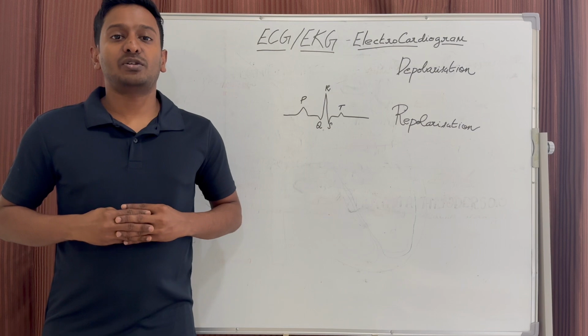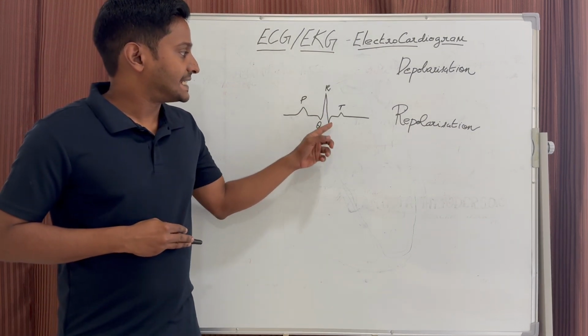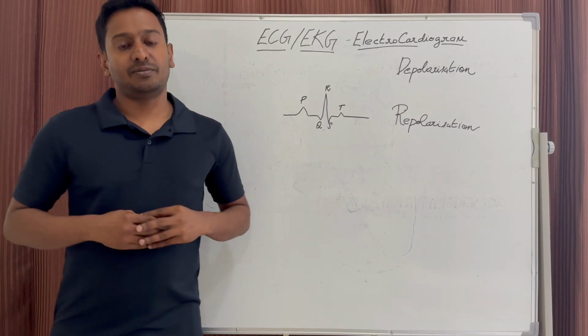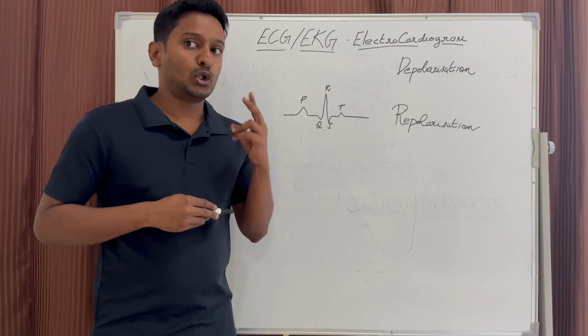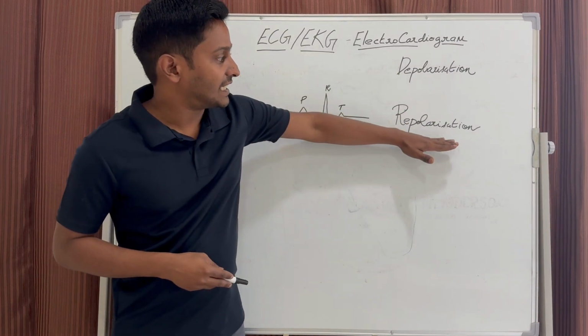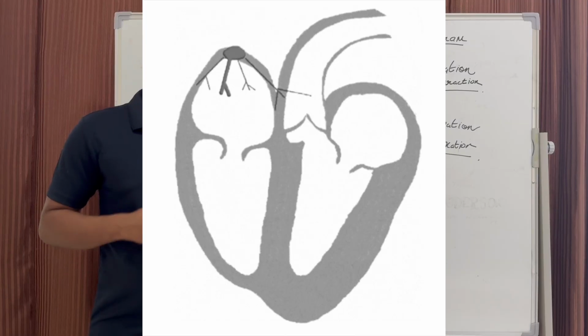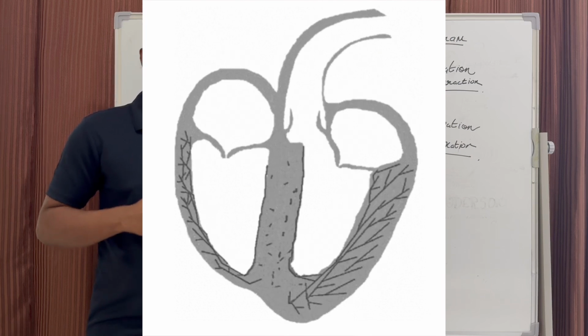Next, we will try to understand about the PQRST in the ECG rhythm. Before understanding that, we have to learn two words, which are called depolarization and repolarization. Depolarization is an electrical activation of heart muscle cells which is caused by an electrical process.